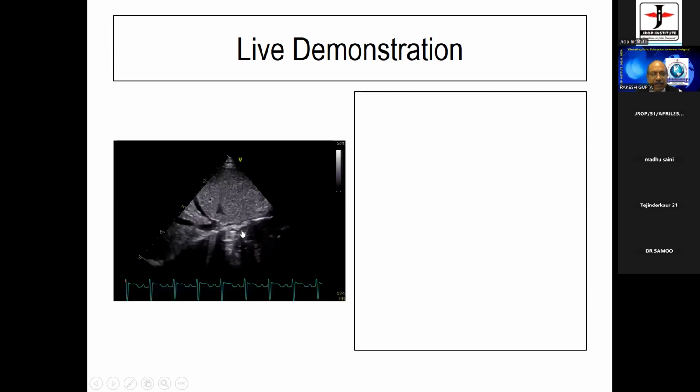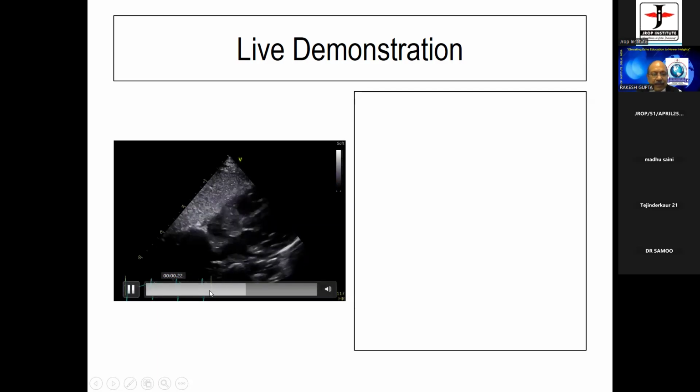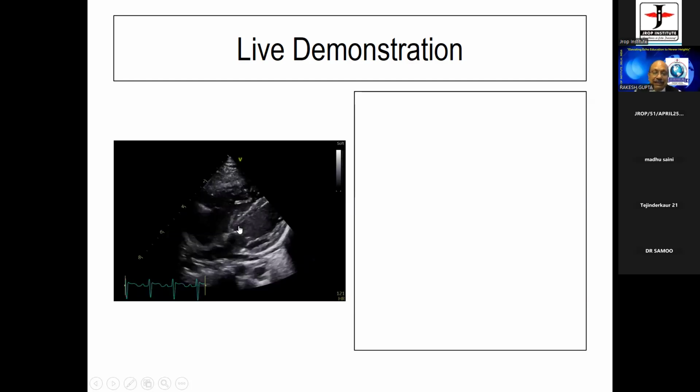I will show you again and try to freeze it over there. Look. Right. So this is attached to the superior margin. This is the IVC. Here is the superior margin, here is the inferior margin. It is attached to the superior margin, directing blood from the IVC to the foramen ovale. And that's a rudimentary structure, what we see later on.